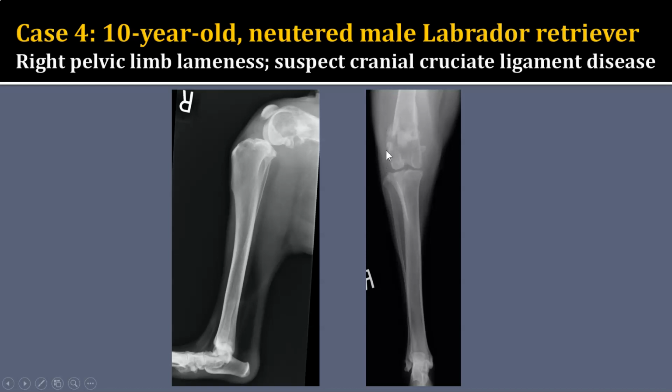And so it's more involving the distal femur as well as that stifle joint, so a combination of intracapsular and extracapsular swelling. When I look at the bones, I'm hoping that we can all recognize that there are quite a few changes going on in the femur here. So I see areas of lysis. This area might be geographic, but then there are areas of moth-eaten lysis more proximal, and this is affecting predominantly the distal metaphysis and probably a little bit of the distal diaphysis of this femur.